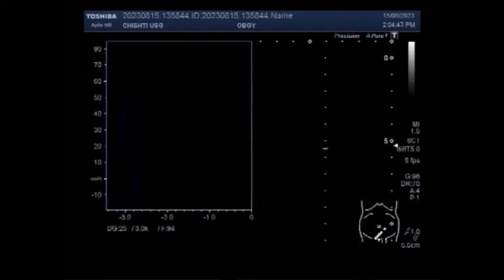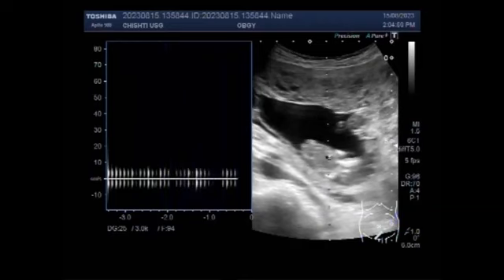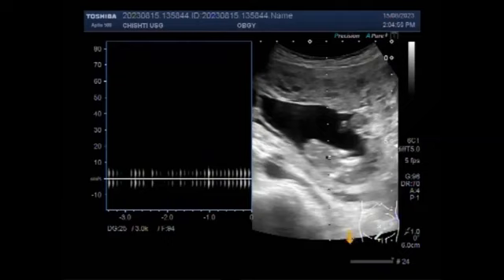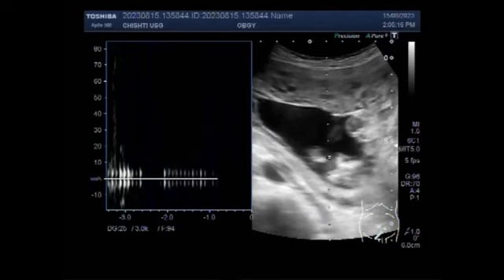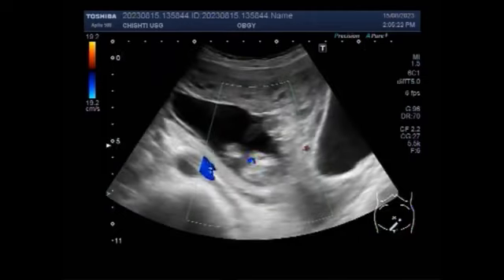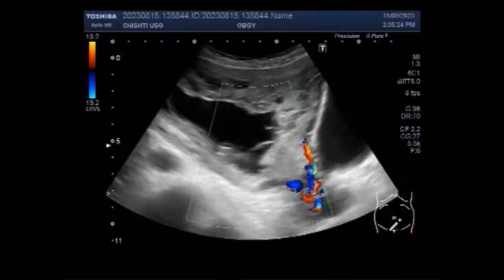Magnetic resonance imaging is important for the diagnosis, differentiation of placental mesenchymal dysplasia and exclusion of myometrial invasion. So here you can see a case of twin molar pregnancy with a hydatidiform mole and coexistence fetuses diagnosed at the gestation age of 11 weeks with fetal demise.